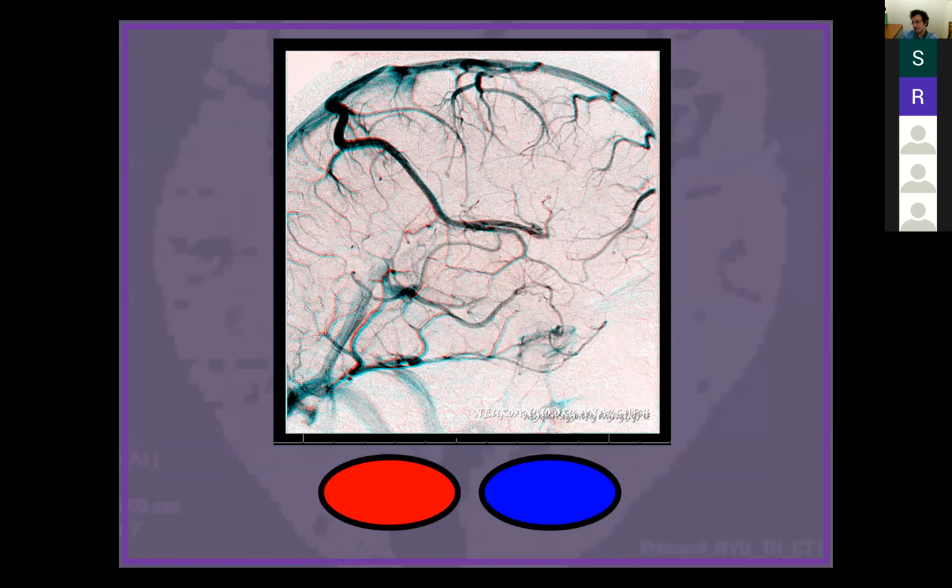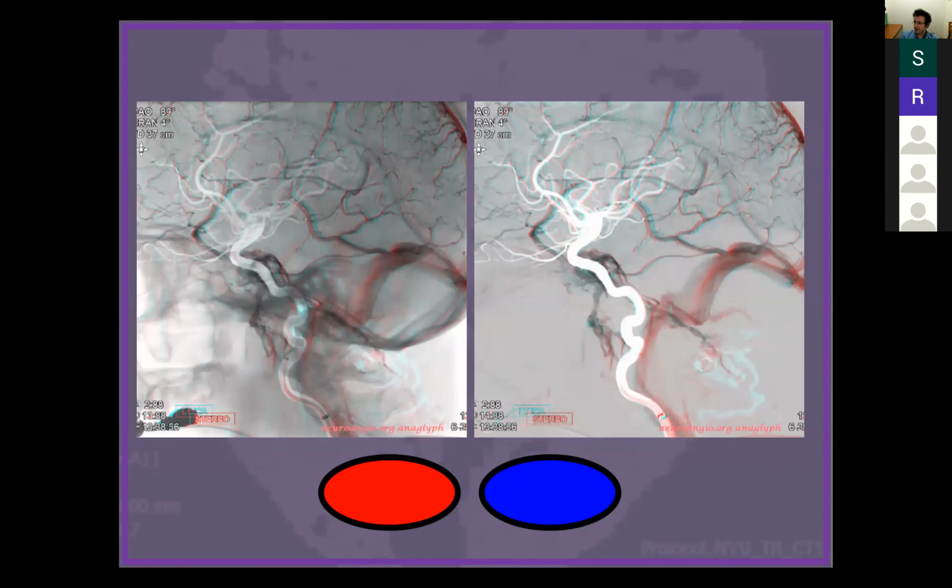So anyway, we use that a lot in the posterior fossa. You can make it even fancier. We talk about imaging the arterial phase, and so you have a double mask or even a triple mask here in the image on the left.